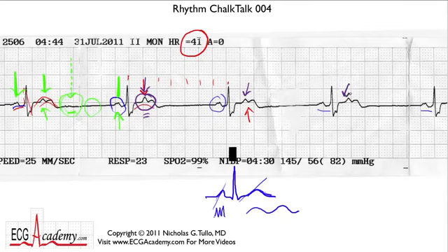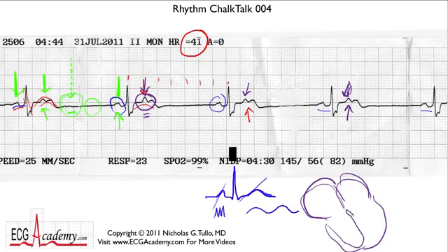whatever you want to call it. It all means the same. It's an atrial event that occurs earlier than it should. Now, that can occur. Remember that the atria are made up of electrically active cells, and any cell in the atria can give rise to an electrical signal. When you're post-operative, there's lots of adrenaline circulating around, and so areas in the atrium can fire, and you can have an electrical signal that gives rise to a P wave, and that's what we are seeing as a premature atrial beat. Well, but it didn't conduct.